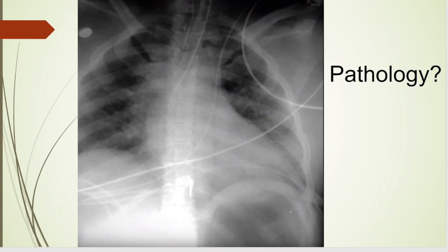So this one is interesting. I wish that it wasn't cut off, but we could see the whole thing, but still you get to see the parts you really need to. Just kind of a crappy chest x-ray. So let's start with A for airway. You can see the trachea coming down here, although it looks like it's a little shifted. Can't really see carina. Just difficult to see. So that's airway, but we see something next to the airway here. Looks like an endotracheal tube coming down, but it doesn't appear to be in the trachea.